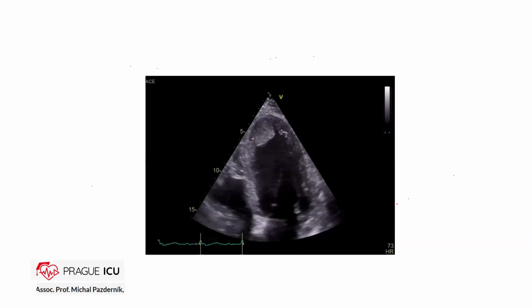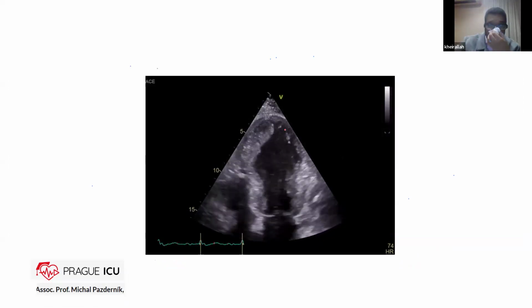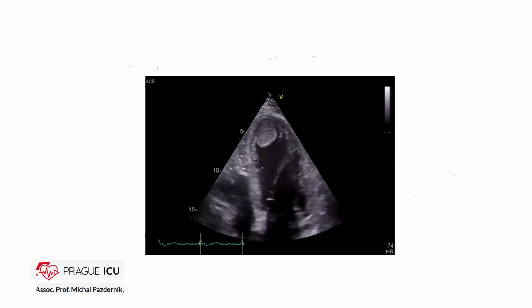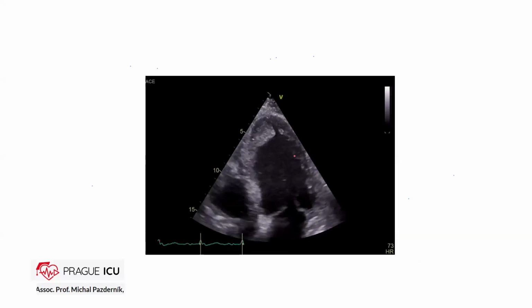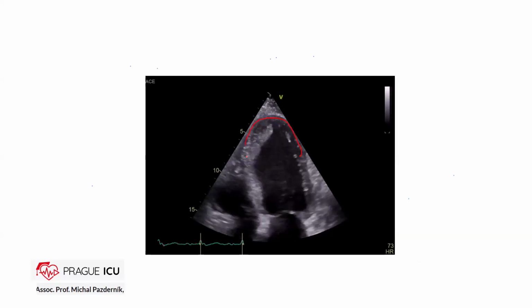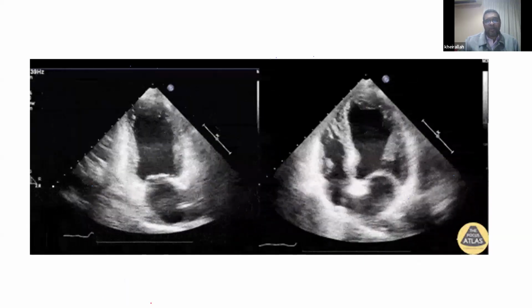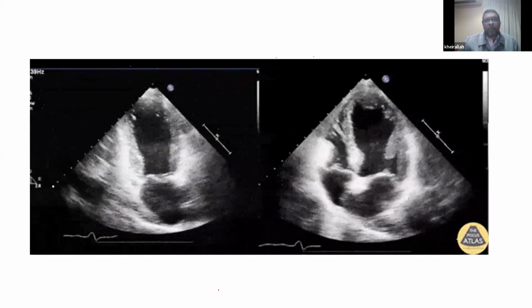And what do we see here? Apical four chamber. Big LV thrombus. And before that, before the thrombus, how about the apical motion abnormality? Akinesia. Apical cap, anterior septum. Exactly. So the apex here is akinetic, and there is large apical thrombus. And here, what do we have?